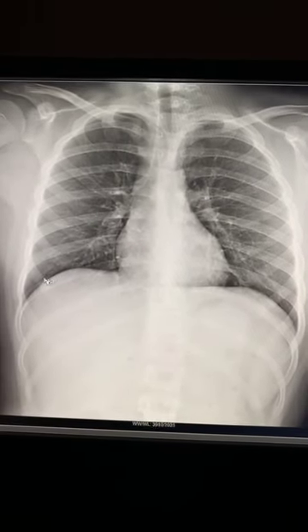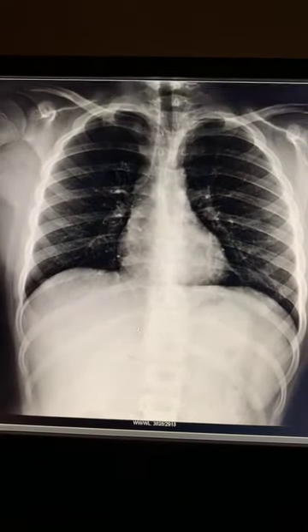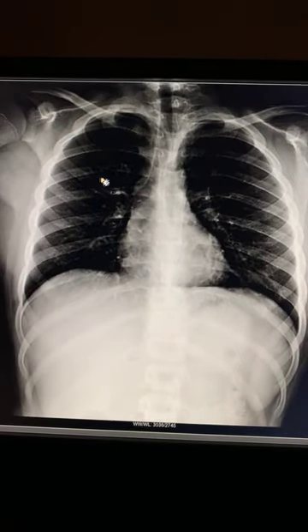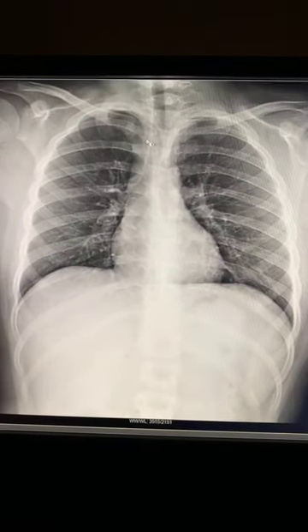I am windowing everything. So I'm gonna window right here to this costophrenic angle. Then I'm gonna go to the other side and kind of window down. Looks pretty good. I'm gonna look at this trachea. Now I wanna make that trachea more distinct, or that mainstem bronchus more distinct. I'm really exaggerating the windowing here, but you get my point.